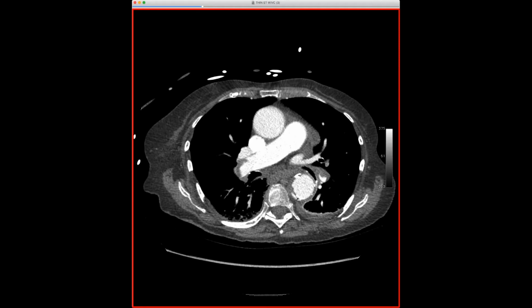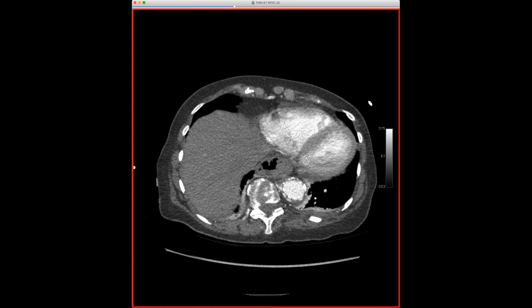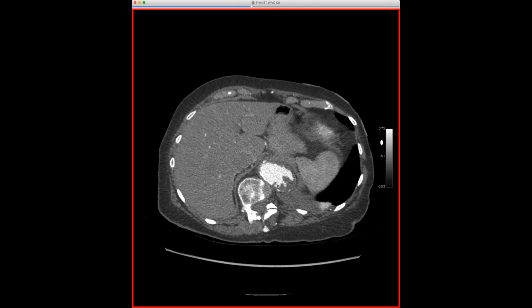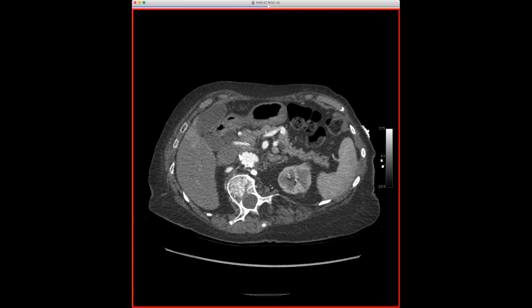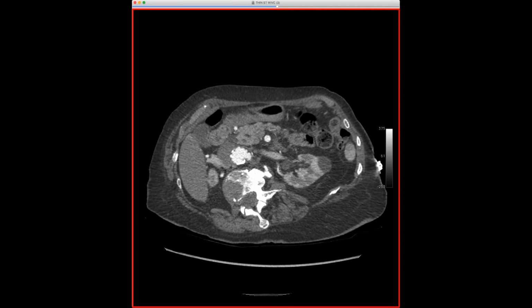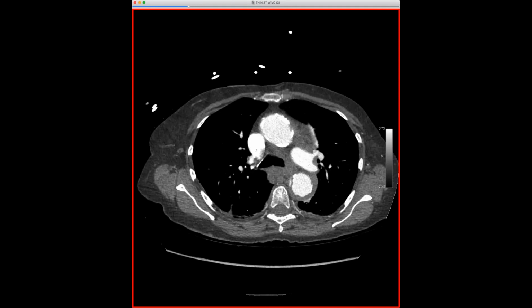Can we look down in the abdomen too? Let's just track this thing down. Yeah, it kind of peters out once you get towards the abdomen. See there, the wall looks pretty good. That's just all atherosclerosis. So I would actually disagree, Jeff. I think that this is probably a type B dissection that arose distally from the arch.